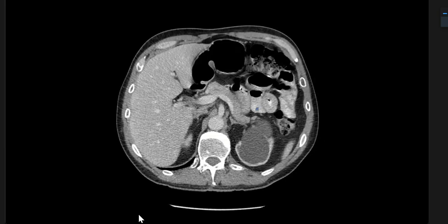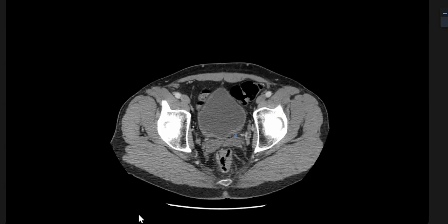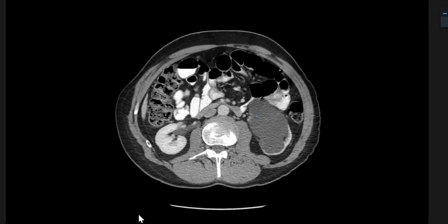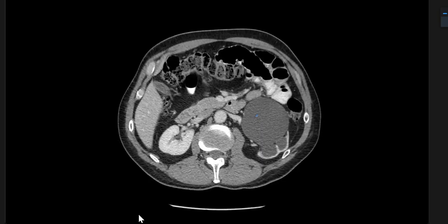There. So the ureter basically, even if you track it the other way around, from here, if you keep tracking up, suddenly you see a sharp transition point. So even here, you can say that's a PUJ obstruction. Then you can ask for the urographic phase. If I give it to you, it's fine. If I don't give it to you, it's fine as well. And then you can ask, okay, I'm really concerned about the function of this kidney because the cortex is very thinned out, so I need to assess the function through the MAG3 renogram.